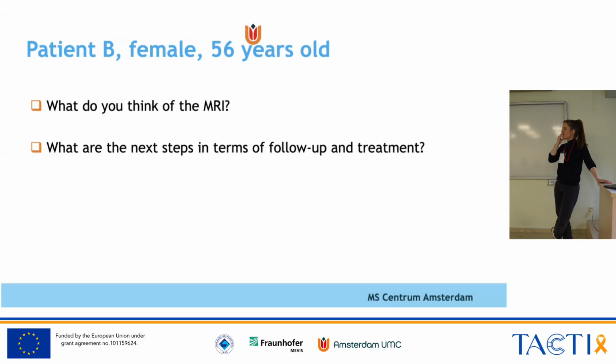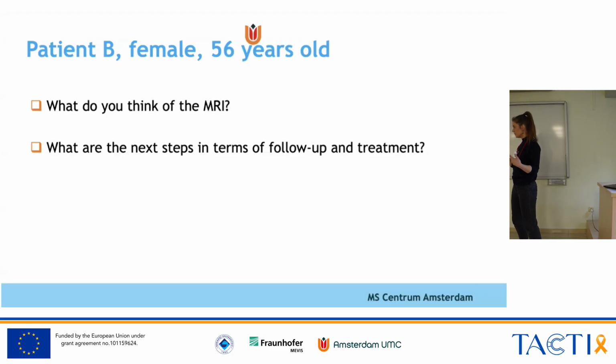The only problem is that there wasn't really a fitting clinical syndrome to start with, but that is perhaps solved now with the new diagnostic criteria, and I think this is an example that we would call not a radiologically isolated syndrome anymore, but multiple sclerosis. And one of the important things is that you also see that there is dissemination in time, so you know that there is still enhancement and disease activity.